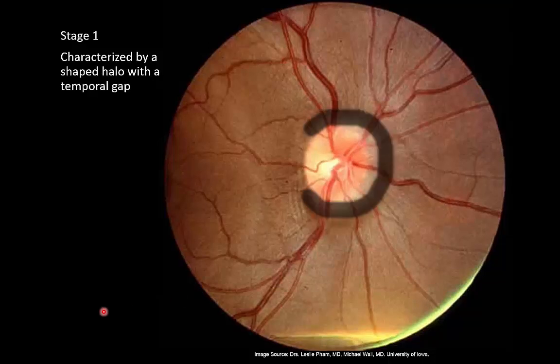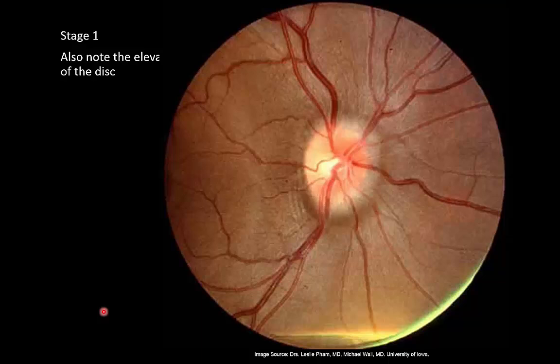This is the kind of inverted or reverse C-shaped blurring of the optic disc. This is what happens first. Now, when we go back and look at this, we also want to figure out, is the disc elevated? And the easiest way is to look at the blood vessels, because when the disc is elevated, you will see the blood vessels leave the disc. They will then run down the hill to the retina.